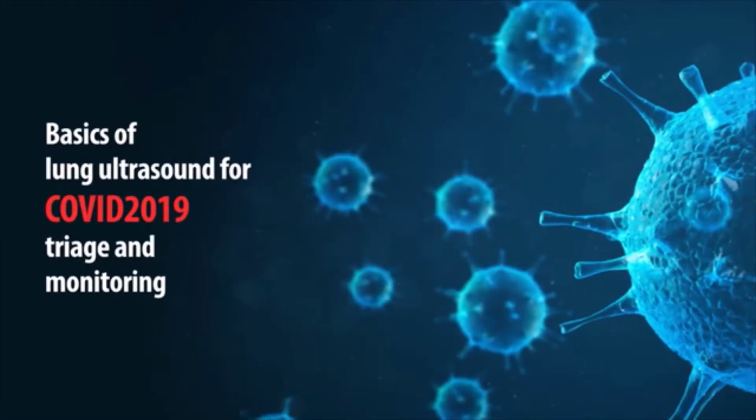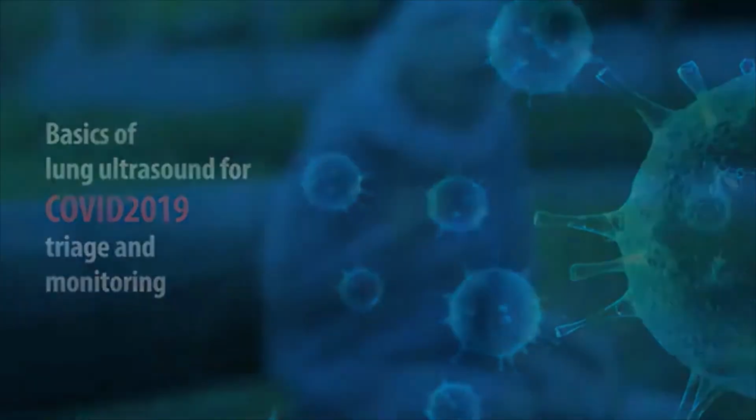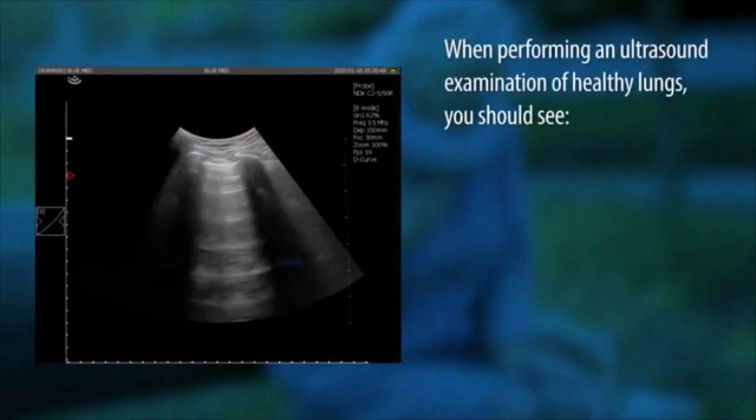The following video describes basics of lung ultrasound for COVID-19 triage and monitoring.